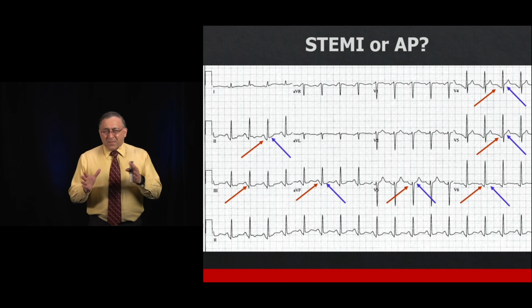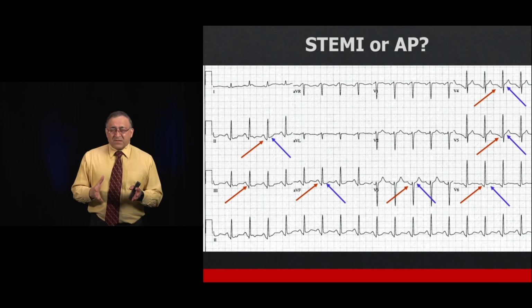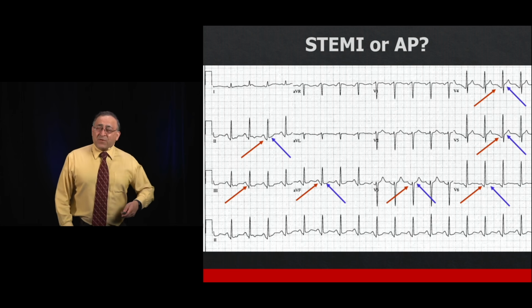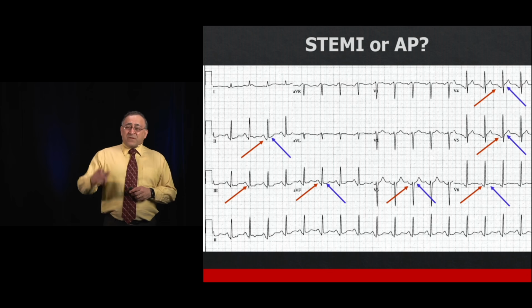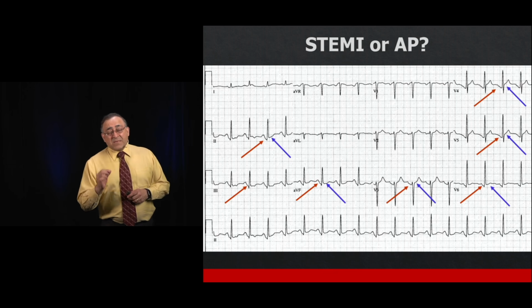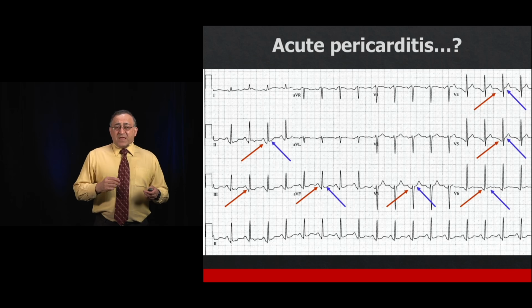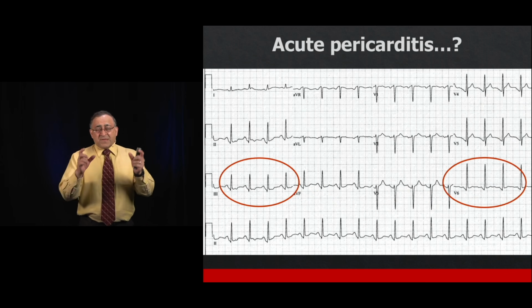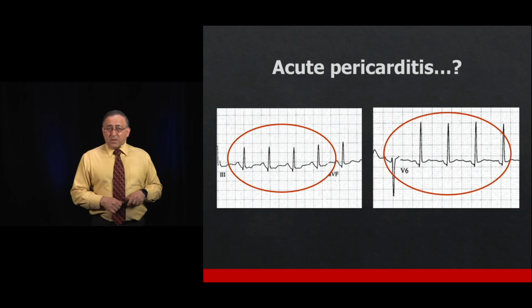So in the meantime, I'm looking at this case and I'm trying to figure out, what did I do wrong? I'm convinced that this is pericarditis. And then I realized that I made the very same mistake that I tell people never to make. And that was the first thing my eyes were drawn to was the PR segment depression. On the contrary, if we take a closer look at some of these leads, in fact, let's just take a couple of leads and let's blow them up and take a really good look at it.